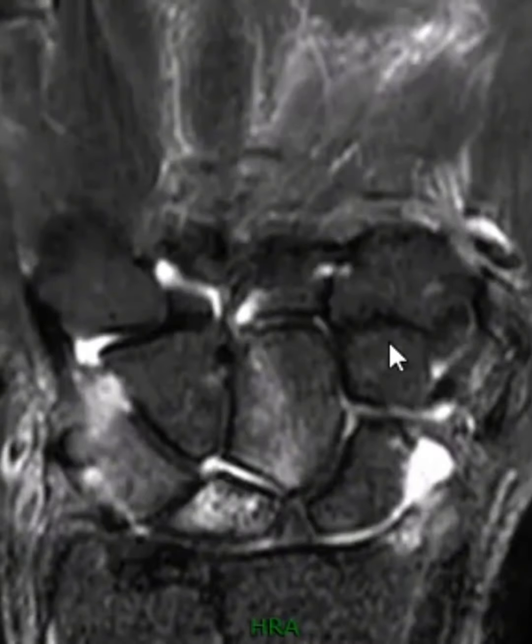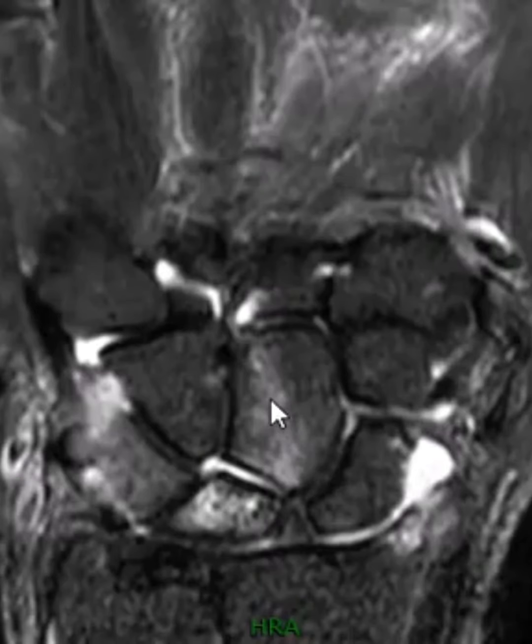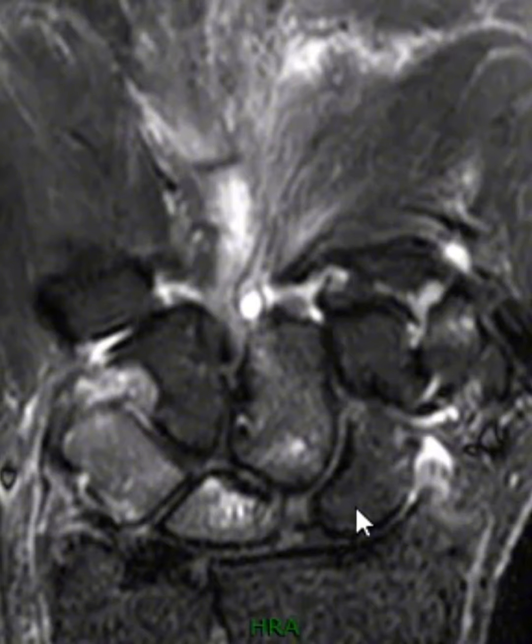We can see some reactive marrow within the capitate bone, some related changes, and that also could be seen with RA, and just proximal migration in this area. And also here the triquetrum bone has similar marrow, but the lunate bone has mostly low signal on other sequences, which is probably some reactive fibrotic changes on top of the marrow. But no, this time there's an example of AVN of the lunate, or Kienbock disease.